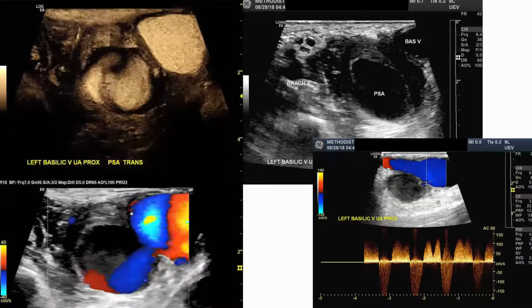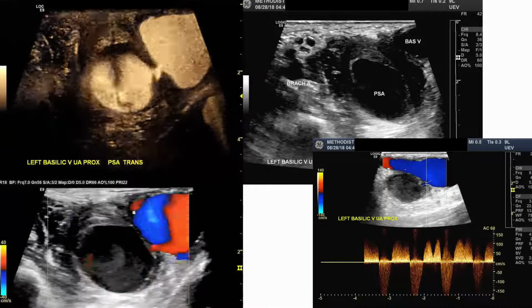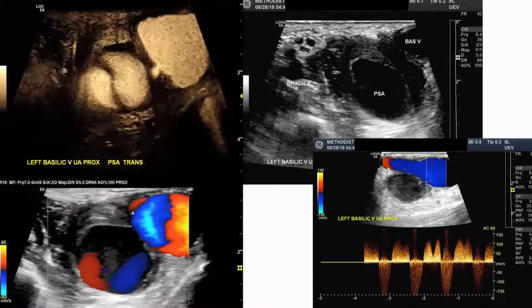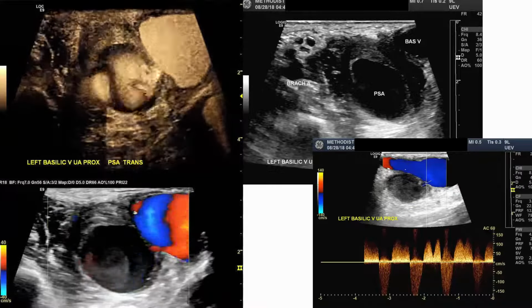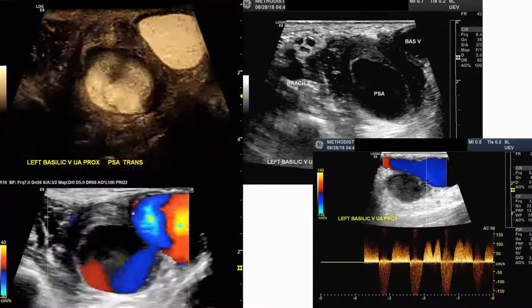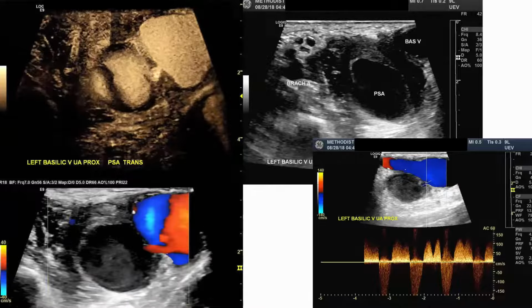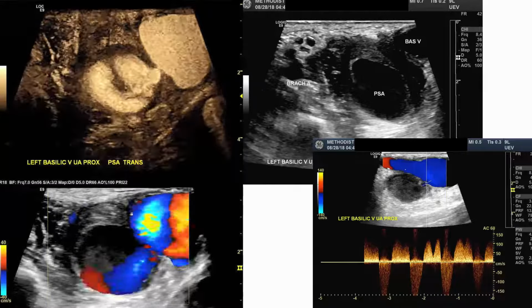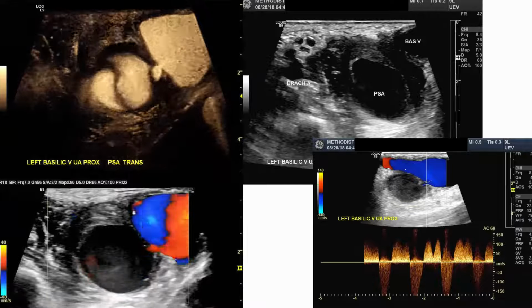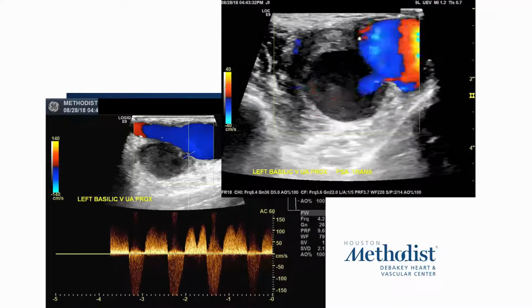The second important lesson that I'm learning is that this is not a Pepsi Cola advertisement by any shape or form, but some people told us that they don't see PCA that often, but we do. For some reason, I think it's very important that you need to see the waveform. So on the right bottom corner, you see that typical waveform of the pseudo-aneurysm. But again, it's really interesting. On the left bottom corner, you see two different red and blue, but the PSA is on the bottom and just the vein formation is on the top.